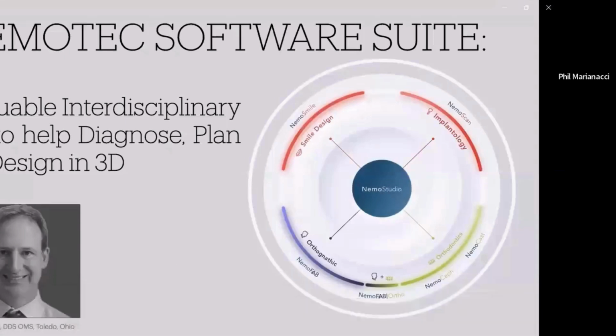Hello, my name is Brian O'Neill, and I'm an oral and maxillofacial surgeon in Toledo, Ohio. I've been working with the Nemo suite software since about 2017, and I can tell you that it has all of the solutions in a single digital, open, and interdisciplinary platform to allow you complete control of multidisciplinary cases for diagnosis, planning, and also 3D design. So I'd like to take you through some of the ways that I use this tool. Again, it's not inclusive of all the functionalities of Nemo, but I hope to give you a bit of an insight and taste in why you should consider incorporating this into your clinical practice.